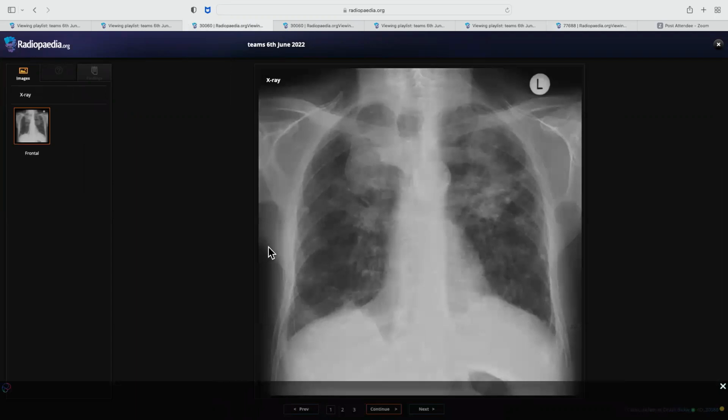So this is a frontal radiograph of an elderly adult patient, where I can see ill-defined confluent opacities at the upper lung zones, associated with a generalized decrease in the lung volumes. There are bilateral upper lung zone ill-defined asymmetrical opacities with areas of central lucency suggestive of air bronchogram.